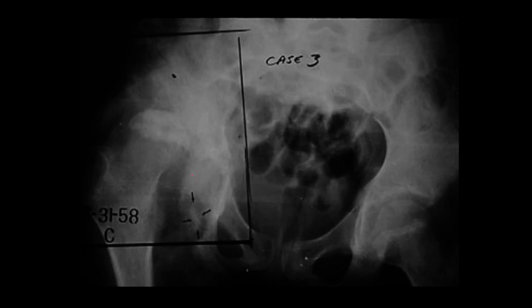It is destroyed. We've lost the lateral aspect. We're now getting more necrotic changes in that femoral head. We're losing some of that normal bone density, and now it's spreading to other areas. So these arrows pointing to this region are showing a new infected focus. So the arrows are pointing at a sequestrum. We don't really have an involucrum or cloaca that is well visualized here, but we've got septic arthritis plus osteomyelitis.